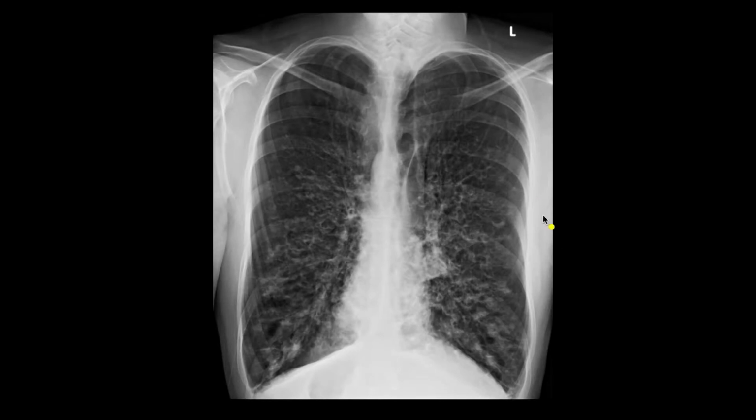This patient, you can see that they have a very elongated cardiac silhouette, and their lungs are hyperinflated. Looking below the left hemidiaphragm, you can't see any gas, and so when you look below the right hemidiaphragm, you can now appreciate that the stomach bubble is actually below the right hemidiaphragm. So not only do they have dextrocardia, so the heart shadow is rotated, they also have a right-sided stomach bubble compatible with situs inversus.